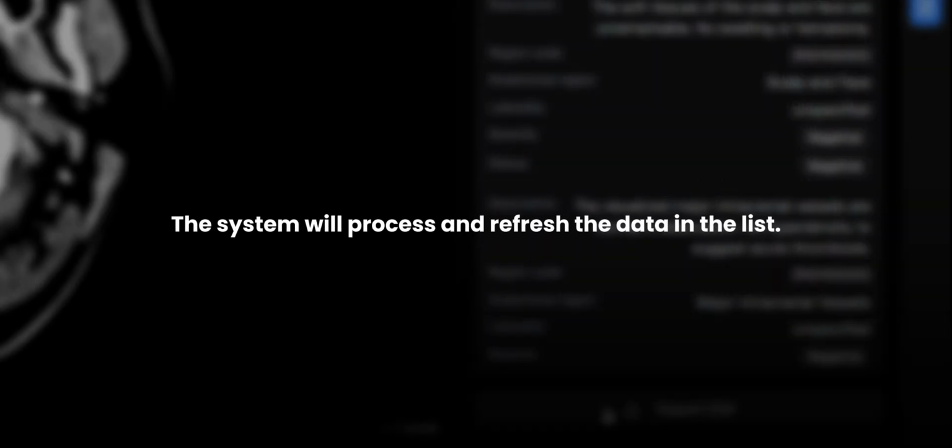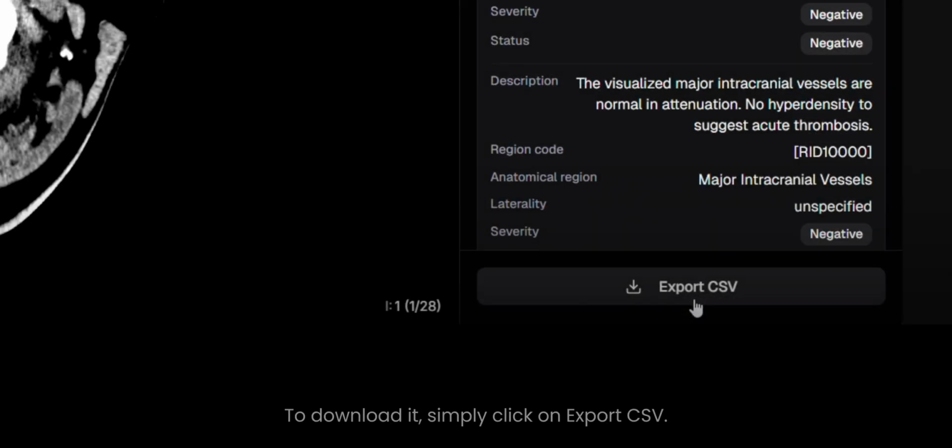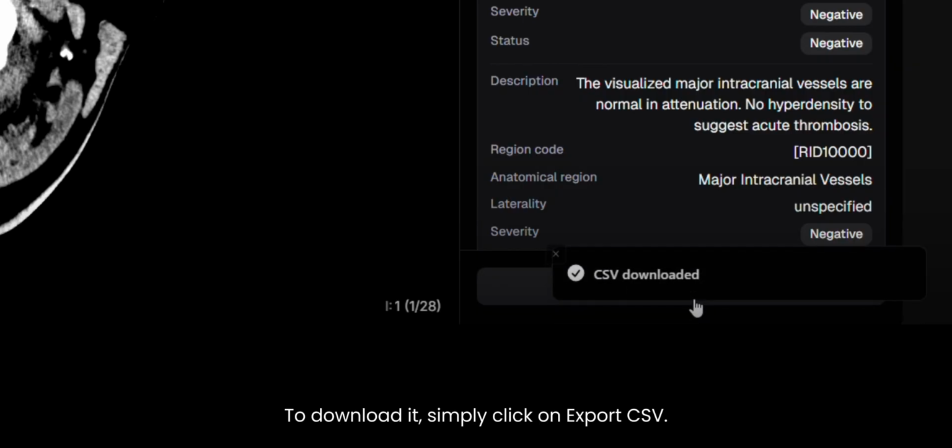The system will process and refresh the data in the list. To download it, simply click on Export CSV.